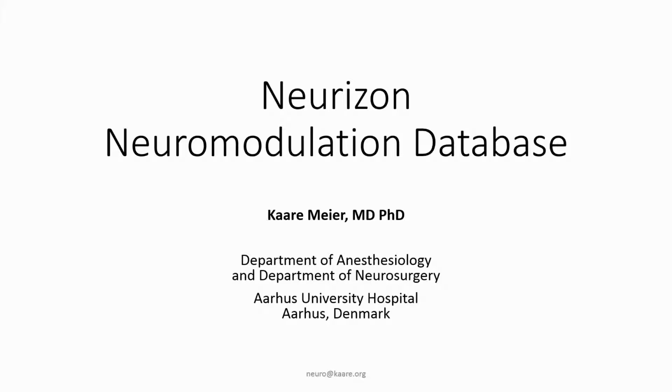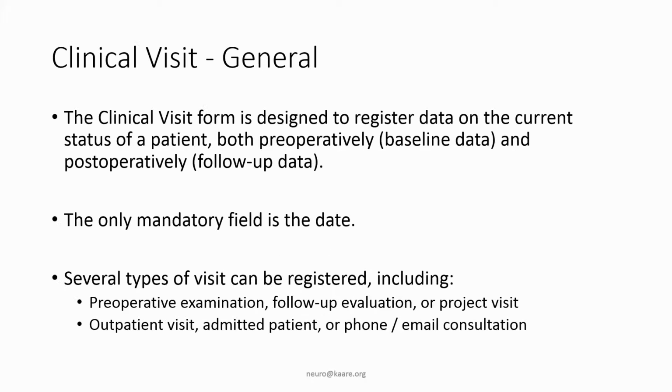This brief presentation will show how to register data into the clinical visit form in the Neurizon Neuromodulation Database. The clinical visit form is designed to register relevant data on the current status of a patient, both preoperatively, that would be baseline data, but also postoperatively, that would be follow-up data for as many visits as is needed for the patient.